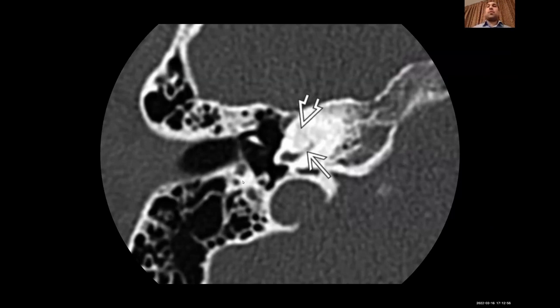Okay. What is the pathology? Can you mention it and say it on the chat, please? I want anatomy and pathology. Start in your mind with the anatomy, and you will find the pathology. Great. Yeah, great. Labyrinthitis ossificans. Suppurative inflammation of the labyrinth, and then calcifications and ossifications with time. It can be a complication of infection of the brain, inflammation of the brain, like meningitis.